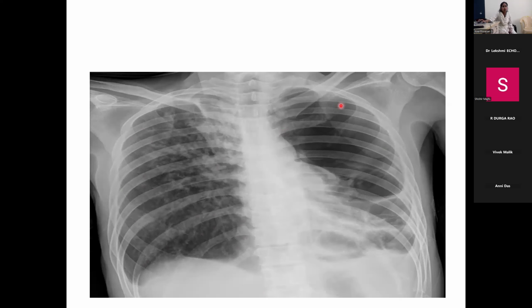And what do you say here? See, here also everything is black, and you cannot trace the blood vessels. But is this a case of pneumothorax? No. Why? Because this is the scapular border. Do not confuse this border with that of a collapsed lung in pneumothorax. Why can I not say this is a pneumothorax? Because I cannot see the collapsed lung border.